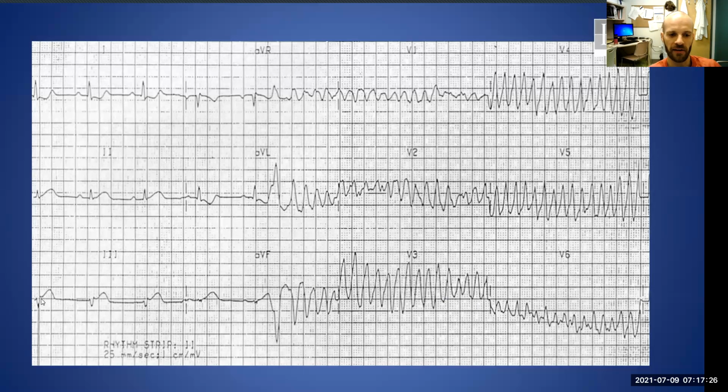Yeah. So I agree. This is one of the reasons why myocardial infarctions kill people, because they get dangerous ventricular arrhythmias. This is someone who I agree has got inferior ST elevation. Then halfway through the ECG, while the ECG is being recorded, they go into this rhythm that looks like polymorphic VT to begin with. Maybe it turns into something more regular at the end of it. But it's very fast. Looks very nasty. This is the sort of thing where if you don't do something about it quickly, then there's not going to be a good outcome. So very good. Excellent.